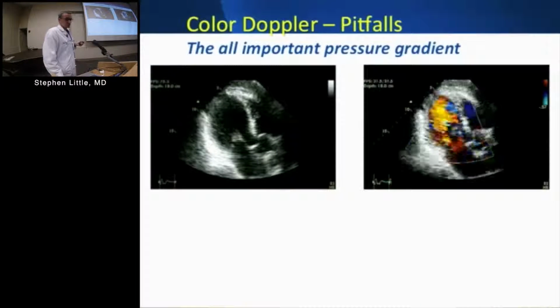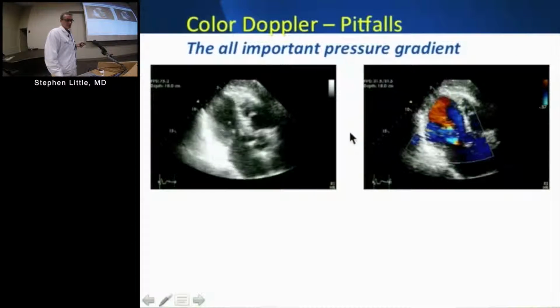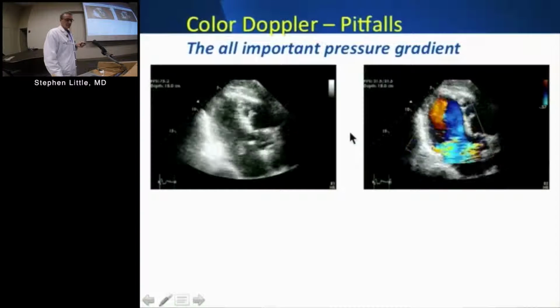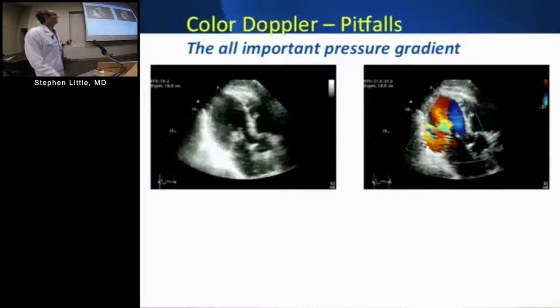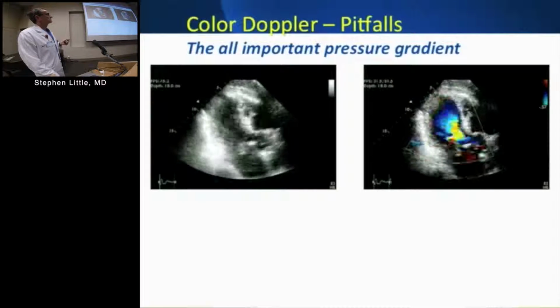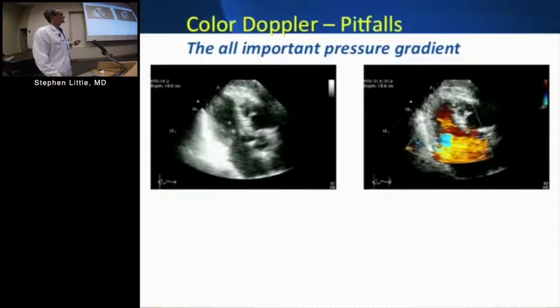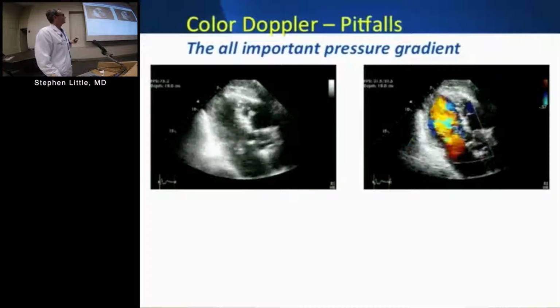So this is an extreme example of pressure change. This is usually a Friday night echo. Lumpiness, maybe someone's calling it endocarditis. Is the valve bad? You look at the color Doppler, it's not too bad. There's not a lot of color there. Not sure what that is.